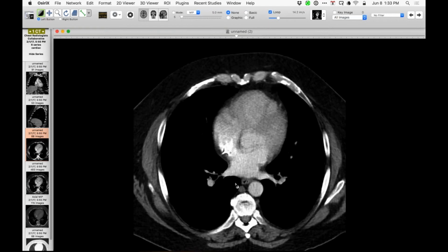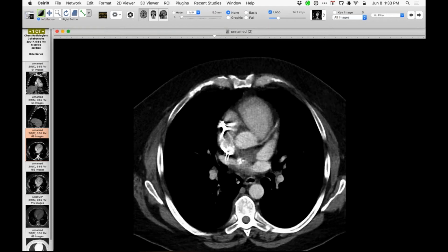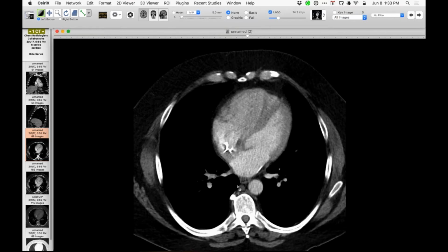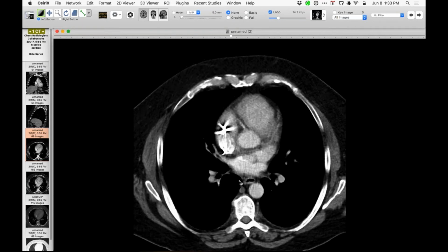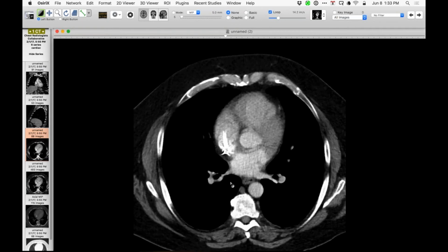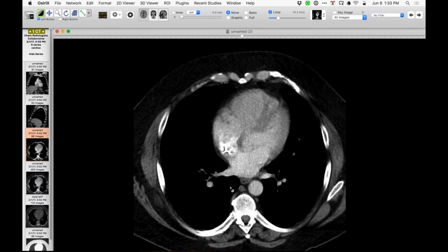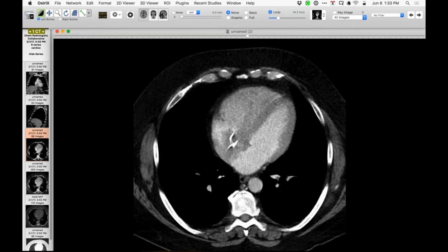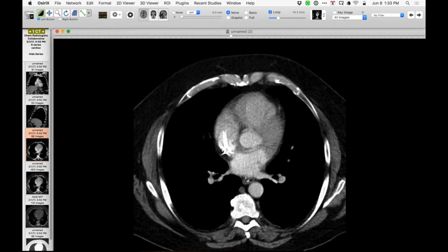I think I have, but presumably folks have seen calcium after ablations, perhaps like that, or similar to that. That's a new one for me. I think of mitral stenosis with a porcelain left atrium or end-stage renal disease, but I've never seen that with AFib treatment. It's so focal and so little. I think that's the likely explanation.